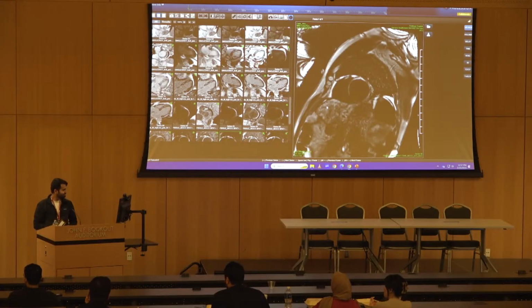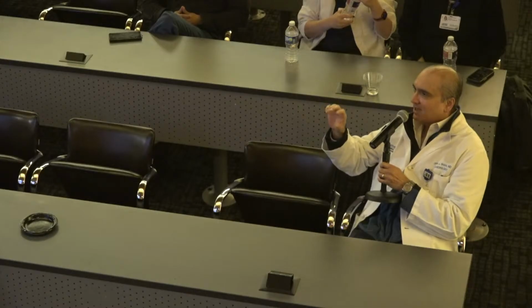All right. Well, first off, I want to thank all the fellows. These are outstanding cases. And if I were to wrap it up, I think the strength of MRI in these types of presentations is this: there's an enzyme bump, so there's myocardial injury that has occurred, but the question is where, and what's the pattern that gives you a clue as to what it is. So it's not just simply identifying that there's myocardial injury, but it's actually the pattern of it, which is different between ischemic heart disease versus a variety of non-ischemic conditions like you're showing us here. And that's where I think the MRI can be very useful.